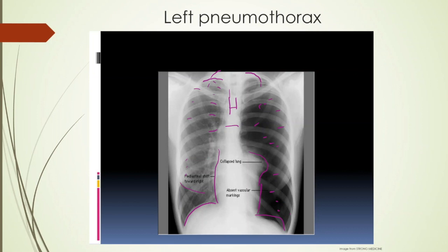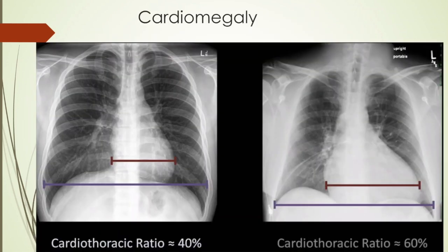So you can see if you do the method, this here obviously just jumps out at you. But again, many pneumothoraxes are much more difficult to pick out. And when you see one thing, human nature, you tend to forget everything else, and you might miss the second or third thing that might be going on. We talked a little bit about cardiomegaly.